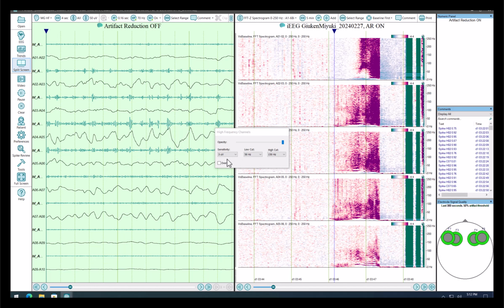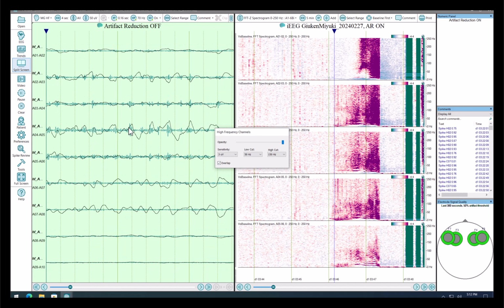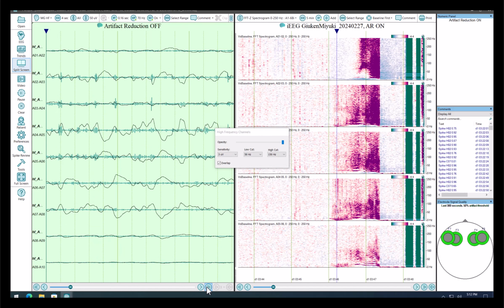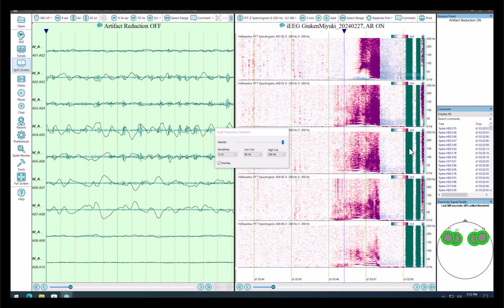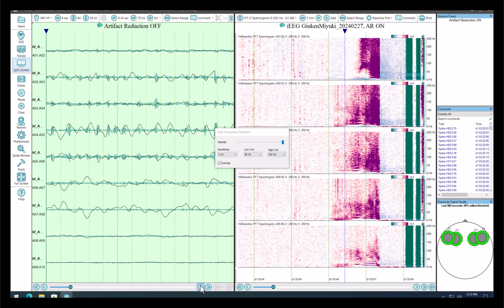Let's go ahead and overlap these. If there was any question about if these are phase locked or not, we can page forward in this. And we're seeing them rendered over here on the right in z-scores, but we're also looking at the actual waveforms here on the left. And if I want to change the frequency range, let's say I want to go up to 300 hertz.